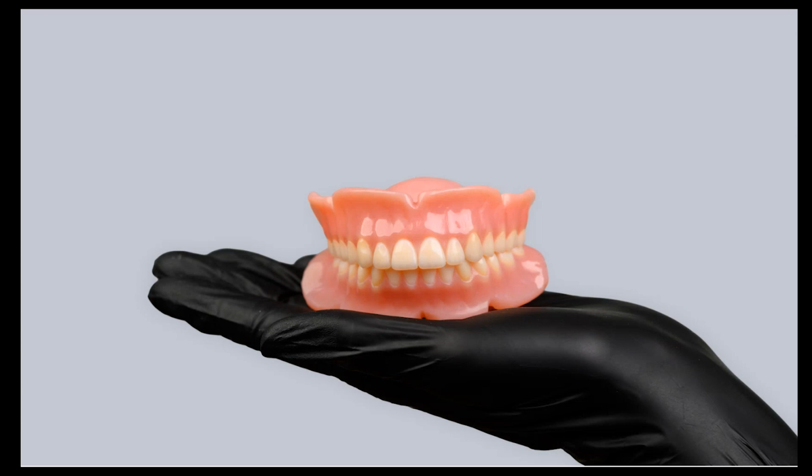I have 2 examples here of models that are not compatible with TrueVoxel. The first one is a bridged model, and you can see that when selecting the teeth, the entire arch is selected. So it means it's a bridge model. And the second one is a model that is not compatible with TrueDent in general because it has a glue gap between the base and the teeth. This is not needed with PolyJet because we don't glue the teeth to the base. We print them monolithically, one of the general benefits of TrueDent.